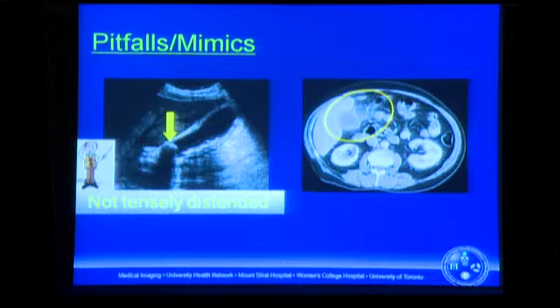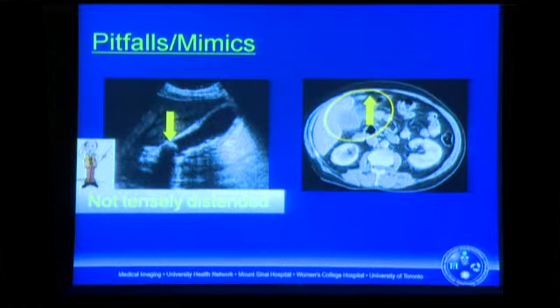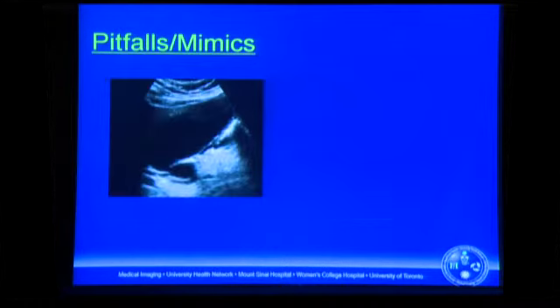And there is inflammation of the gallbladder because the inflammation has tracked up the duodeno-hepatic ligament, but acute cholecystitis is not the primary cause. And the CT confirmed the free air, so this patient had a perforated duodenal ulcer.